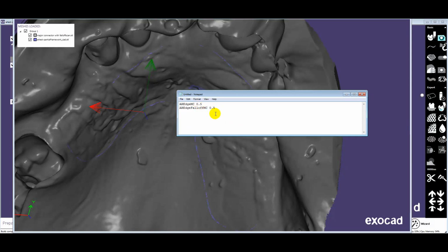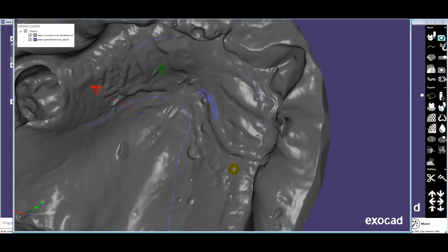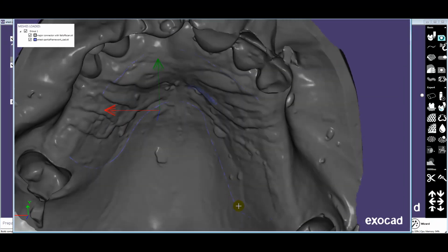Obviously, I chose 0.5 millimeter because I'm assuming that it's better to have this fairly thin. The risk is, of course, when you have this coinciding with the surface as it is, I would imagine it's more likely that you would have some sort of fit issue. But if it's really thin, you can just sort of work that away. You can probably find where that is occurring. This is a much safer approach than turning off auto relief under the whole major connector because it's going to be much harder to tell where the problem is coming from.